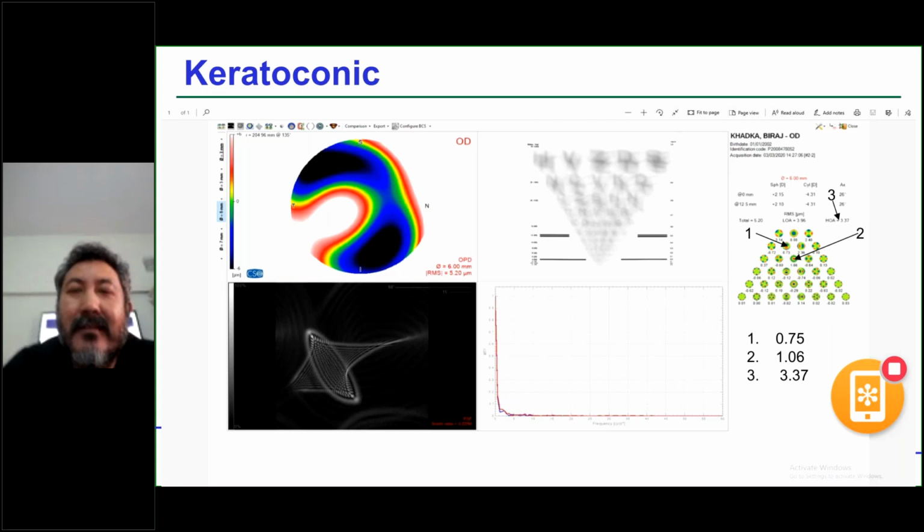Okay. There are other types of corneal topography as well. So why is the ZEUS MS-39 considered so important as compared to the other corneal topographers?